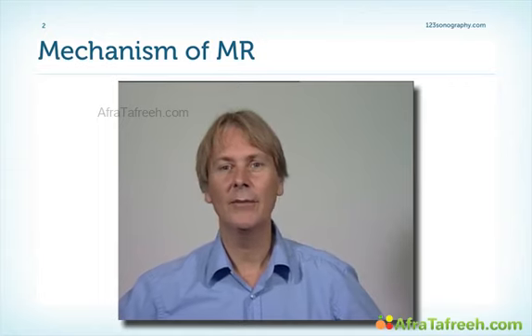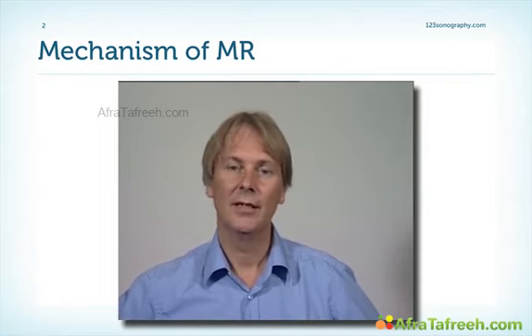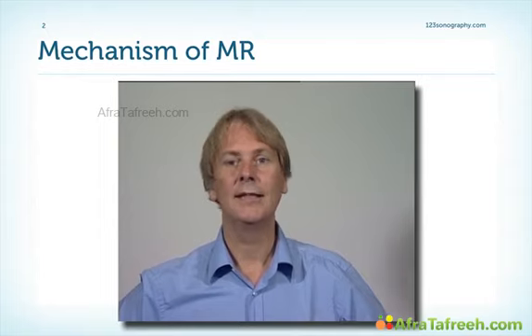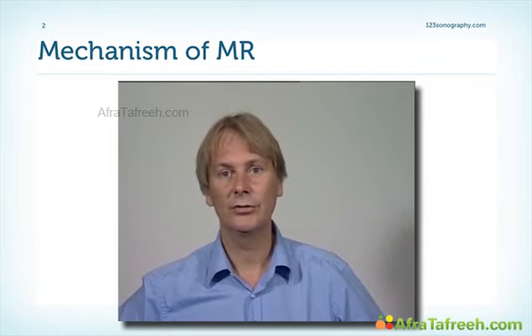We're now slowly coming to understand the physiology of mitral valve closure and also the mechanism of regurgitation. 3D echocardiography was probably the technique which helped most. We now know exactly what the shape of the mitral valve is and how, for example, the leaflets and the annulus move during systole. But does it matter why the valve is incompetent? Yes, it does. Because based on the mechanism, we also decide the treatment strategy. And the surgeons want to know too.